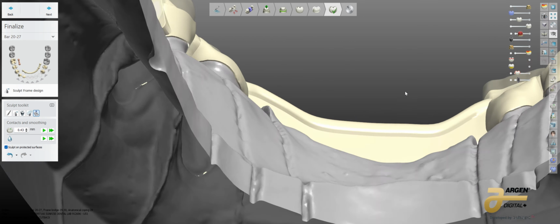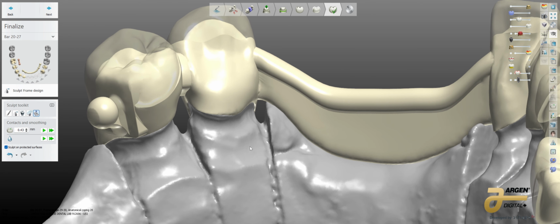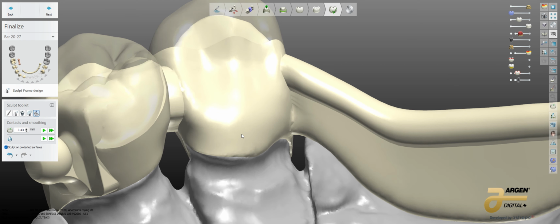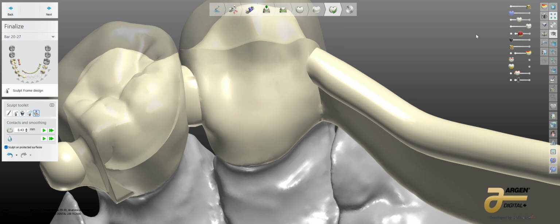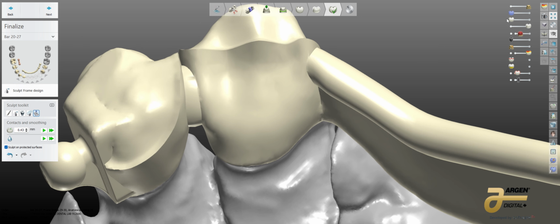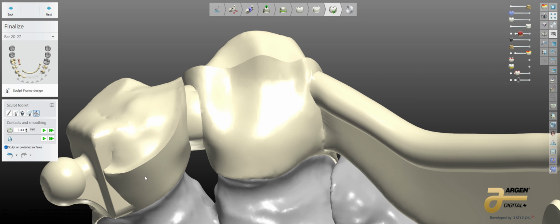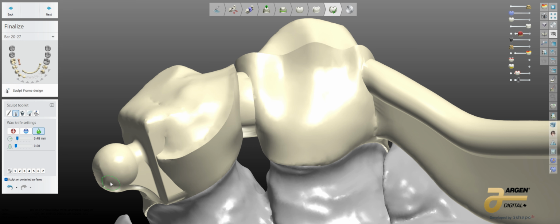You can see very small compression, very lightly up off that tissue, but all my strength. Now, if you looked at where we had this aspect over here when I did that cutback comes all the way up here. Let's go ahead and minimize this real quick. And let's take a look. So if we understand that this sculpt on protective surfaces is on, what's going to happen if I take this tool? Well, nothing. It's protected at that point. Just like my attachment, it's protected at this point.